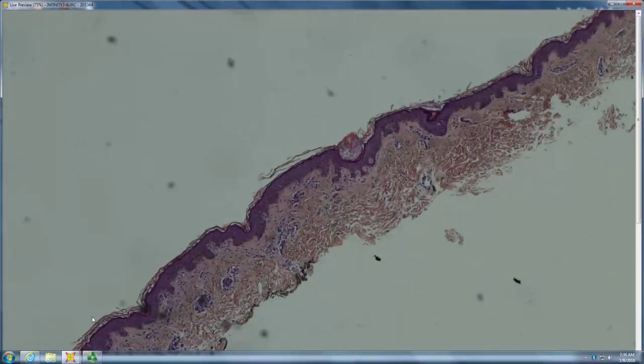Is there anything very dramatic here? No, not really. This is syphilis. It is the great imitator. It has a huge spectrum of changes clinically, and if it's going to have a huge spectrum clinically, then it's going to have a huge spectrum histologically, right?